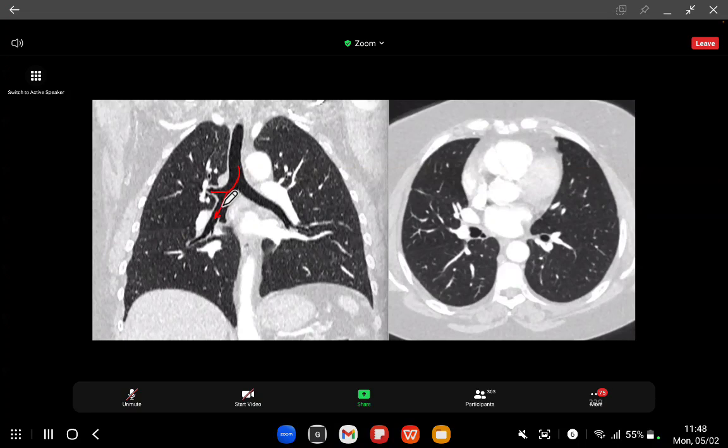And what we don't see, which is more anteriorly placed, is the right middle lobe bronchus coming off, okay? But this is the cardiac bronchus and it goes off towards the heart. Don't worry about it too much because it's incredibly rare.